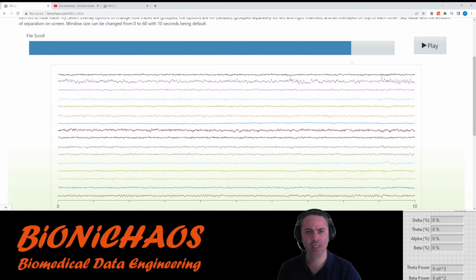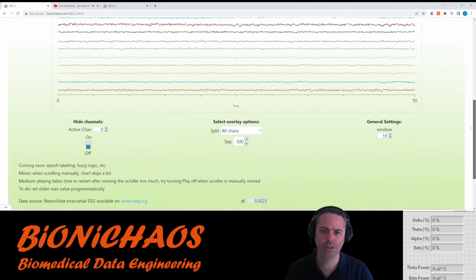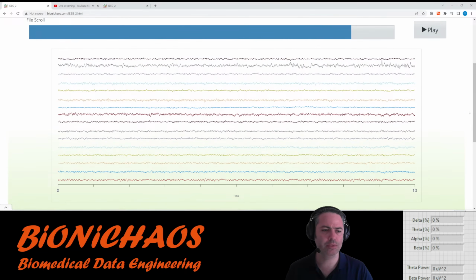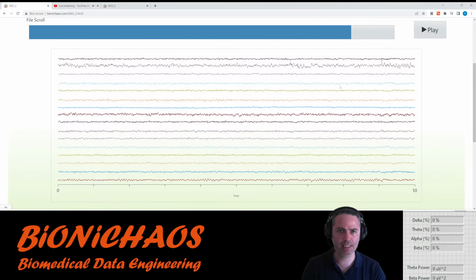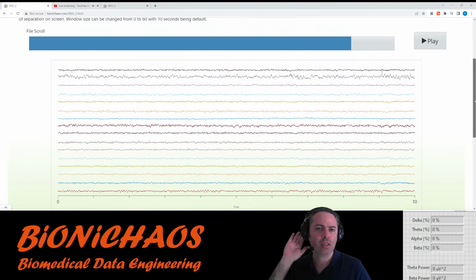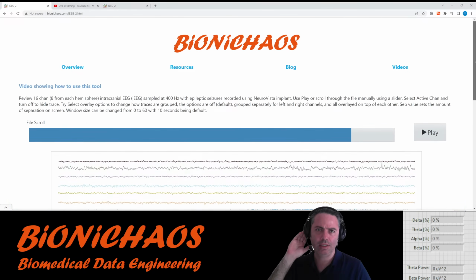And now it's working okay. There will now be an example of this 16 channel EEG, which is the source for it. There will be another file which actually has spiking activity, from the subject during recording during seizures, but I haven't added it yet.